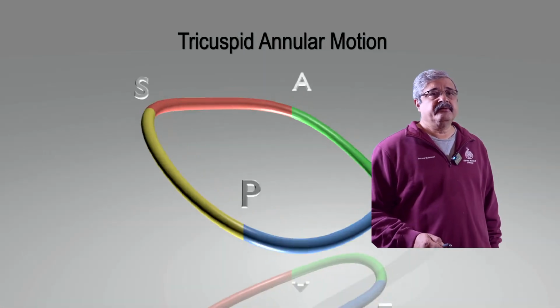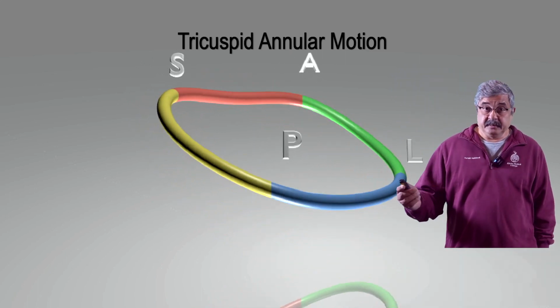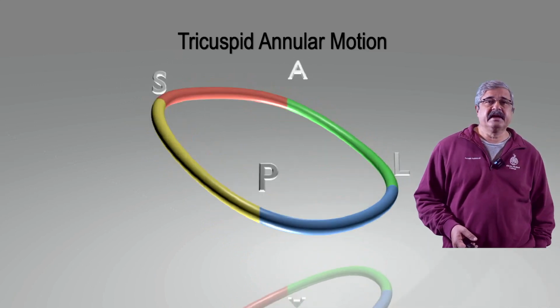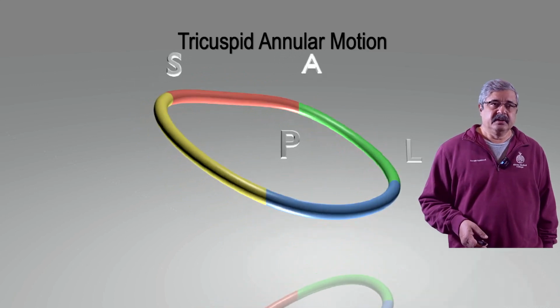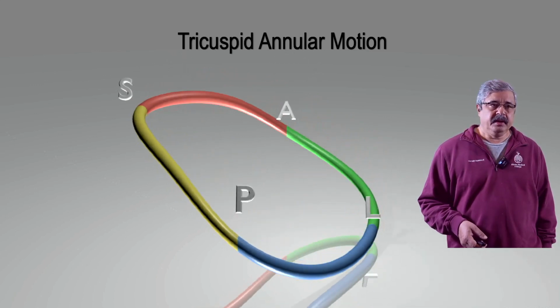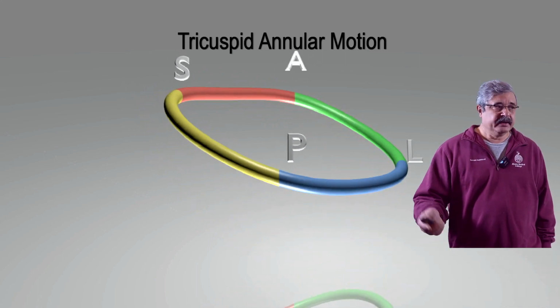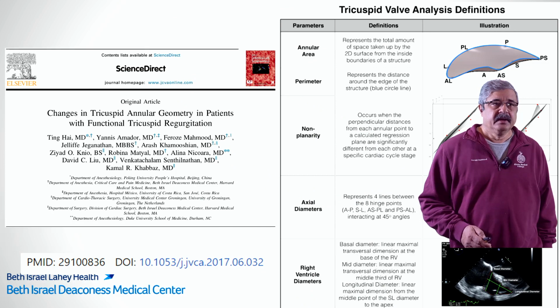I'm not going to go into the detail how we found that, but we even tried to define, in a 3D Blender program, the motions of the various parts of the tricuspid annulus to show how it moves in 3D space. As you can see, the lateral portion over here is the most mobile, and you can appreciate the TAPSE over here as well.